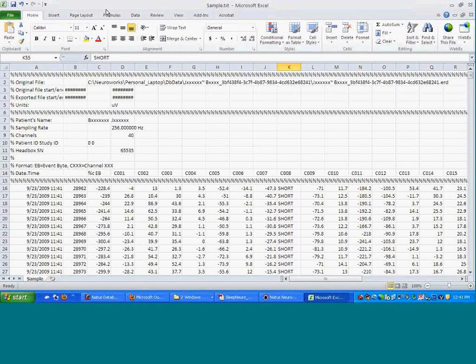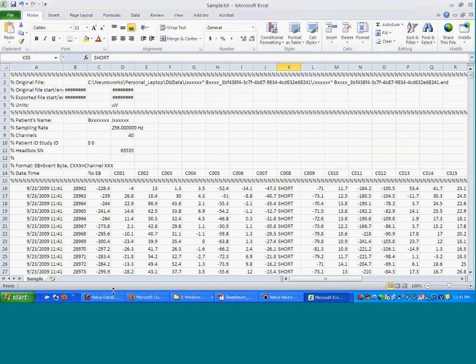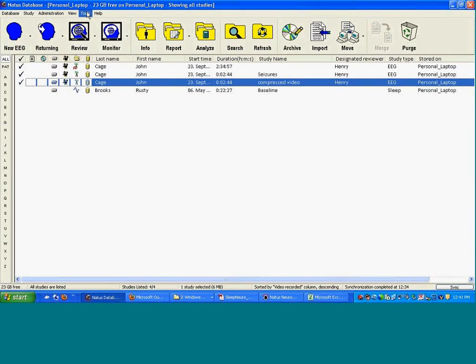So I'm going to end with showing you, actually let me go back. I'm going to end with talking briefly about the ICU Touch option. If you are interested in utilizing a touchscreen monitor, this option is available.